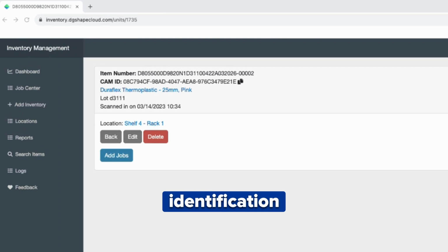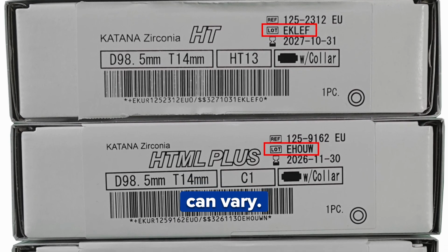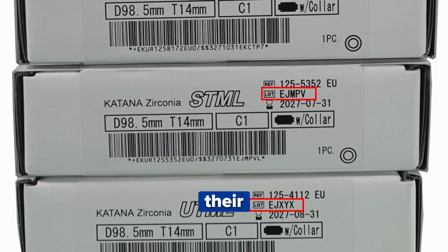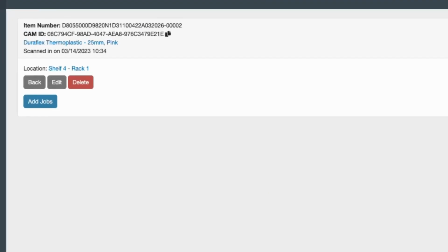The lot number is an identification number that assigns your CAD/CAM unit to a quantity or lot of material from one manufacturer. Lot numbers for materials can vary. The ability to track jobs by lot number will save you time should a manufacturer find a defect with their materials. If no lot number was entered when adding new material, there will be no number displayed here. You do have the ability to add a lot number by clicking the Edit button in this panel.